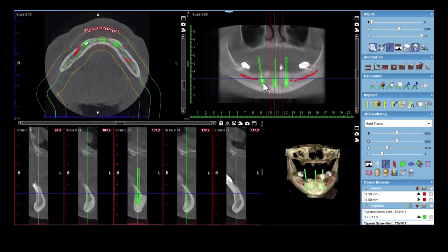I typically like to angle them. And I really will set these up similar to if I was going to do an All-on-X procedure. So if this patient decided he would like to have fixed, it's really just a matter of probably adding an implant here and here. Sometimes I'll go ahead and do 4, then it would be super easy to convert. But we try to balance the cost of these to make them as reasonable as we can. So 3 implants and then only 3 connections on the bar, and I found that that's plenty solid. So I go with that.